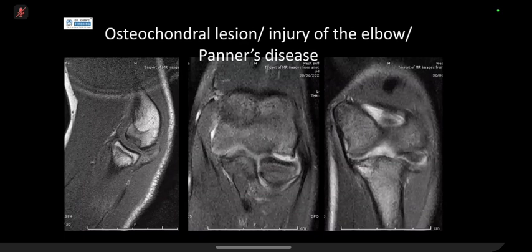Now, Perthes is really avascular necrosis, or you can think of it as osteochondritis dissecans or osteonecrosis. So for the next few slides, I'm just going to show you Perthes-like diseases in other areas of the bones of the body. If you take away Perthes and think of it as an osteonecrosis syndrome or pathology, that helps with the next few slides.